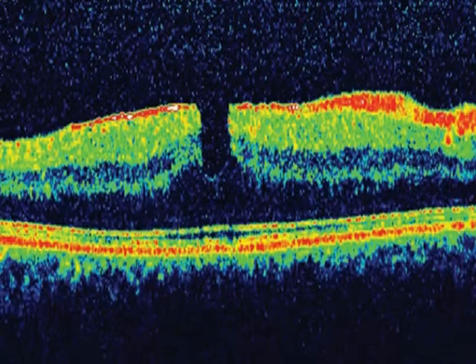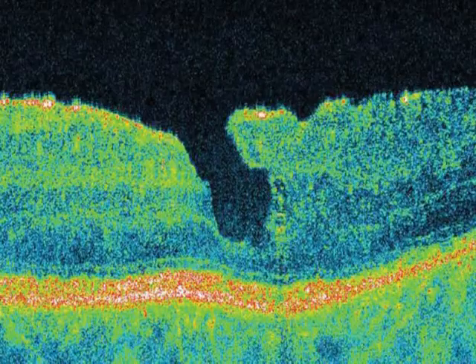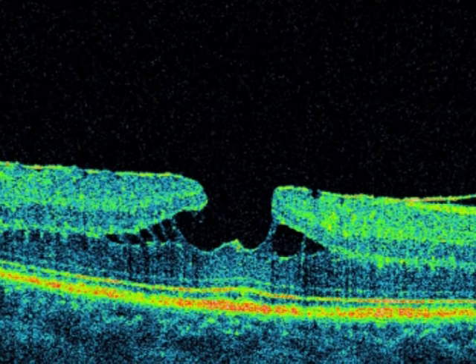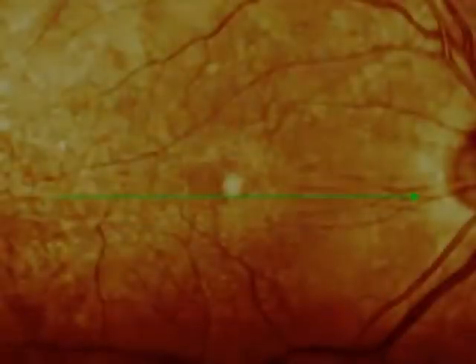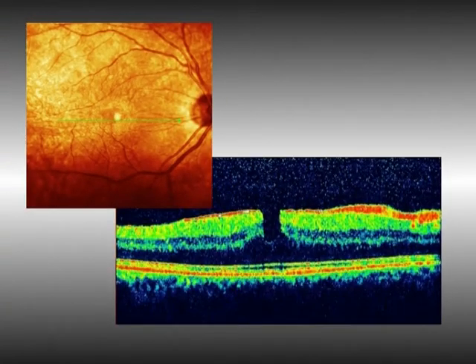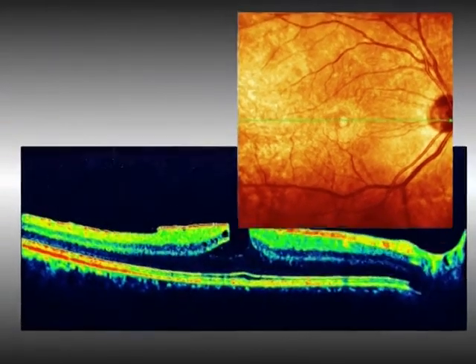By examining central B scans, we can distinguish four different types of non-full thickness macular holes: macular pseudohole, pseudohole with lamellar defects, paralamellar macular hole, lamellar macular hole. If we look at different B scans taken during a single examination of a non-full thickness macular hole, we can observe different manifestations of the disease on individual B scans.